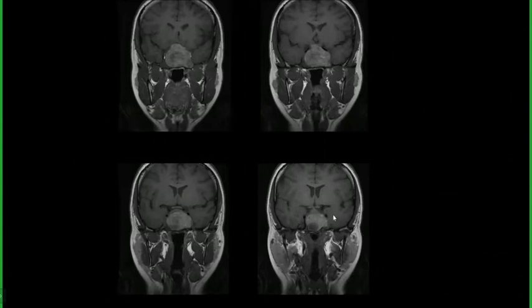At the level of cavernous sinus, where the artery. Which plane? Axial, coronal, sagittal, oblique? Which will be better here? For sphenoid sinus to the pituitary gland, sagittal is better. Okay, sir. Which will clearly demonstrate the pituitary gland separate from the sphenoid sinus. For optic chiasm, yes, we can look at both coronal and sagittal.